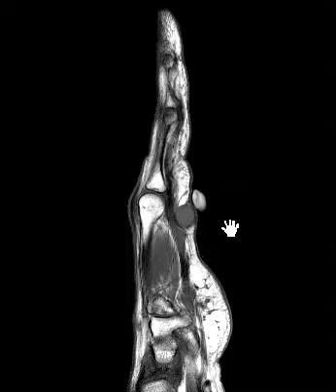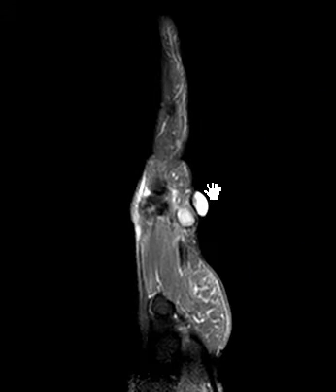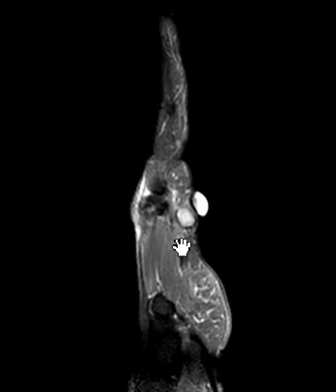So there's a mass right where she's feeling the palpable abnormality. And it is intermediate in signal. Muscle is here. It's kind of close to muscle. If we put up another view, a T2 weighted sequence where fat is suppressed. As a fat suppressed T2 sequence, all the subcutaneous fat is dark, marrow is dark, and here we see it's a little bit hyperintense, a little bit brighter, very sharply defined margins.